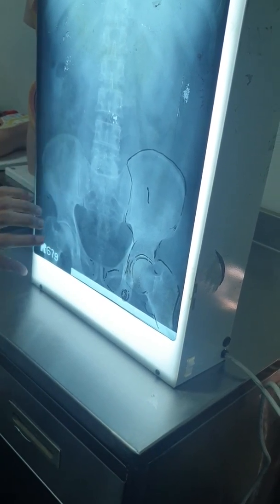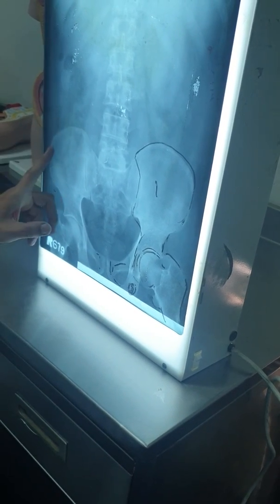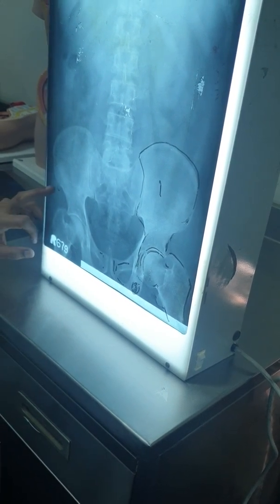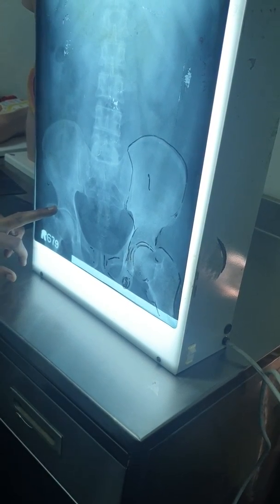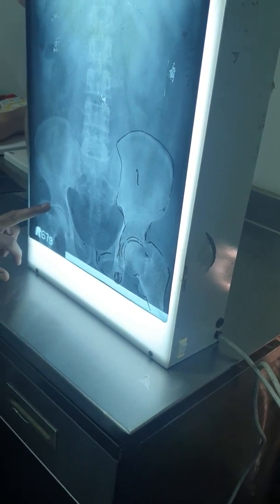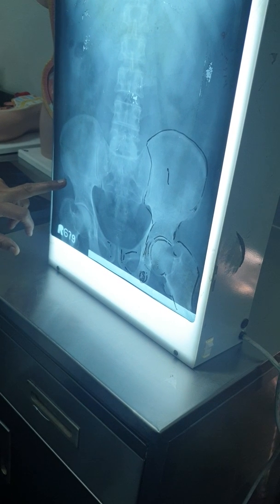In the hip bone, identify 3 bones: ilium, ischium, and pubis, iliac crest, sacroiliac joint. Somebody might put a pointer arrow here. What is this? Anterior superior iliac spine. What is attached here? Second question: what is this? What is attached here? Identify this. What is the attachment here?